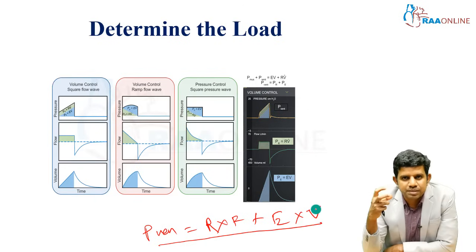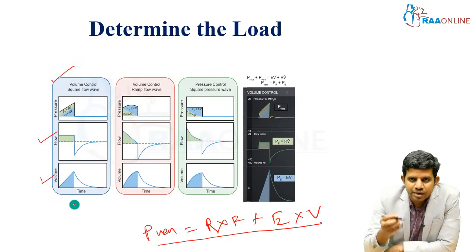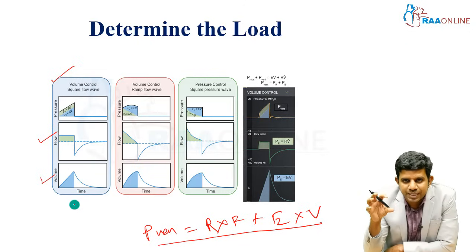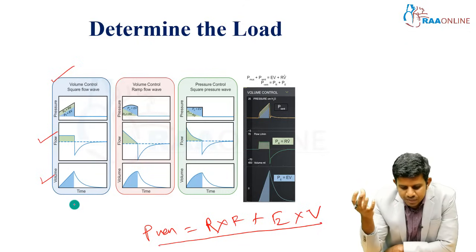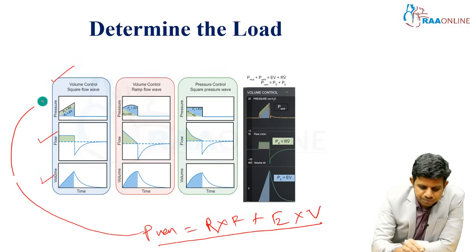Most commonly, what waveforms will we see on our ventilator screen? The pressure-time scalar, the flow-time scalar, and the volume-time scalar. These ventilator waveforms are actually expressing our same equation of motion. Your pressure waveform is expressing your P vent.